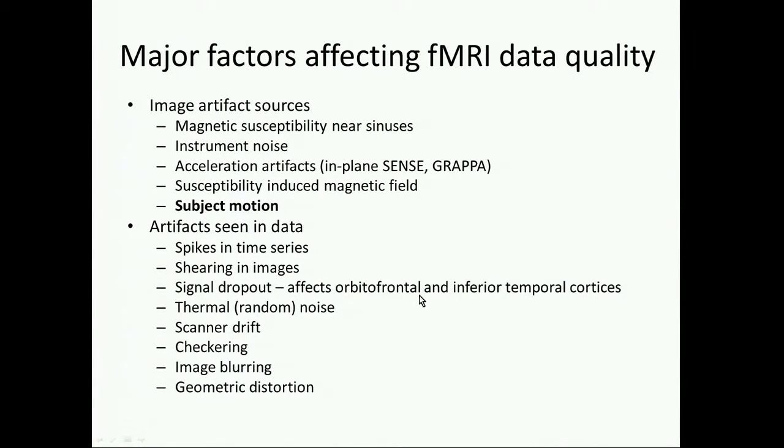So many of you, possibly all of you, are acquiring fMRI for various reasons. And as you also may have heard or know very well, fMRI is very susceptible to artifacts, just as much as structural imaging is. Although fMRI artifacts a lot of times can go unnoticed because fMRI is a time by volume sequence. So a lot of times you may look at the first volume and it looks okay, and then you kind of move on. But it's really vital to actually play the data. So what are the various, there's numerous physical sources of artifact in fMRI data.